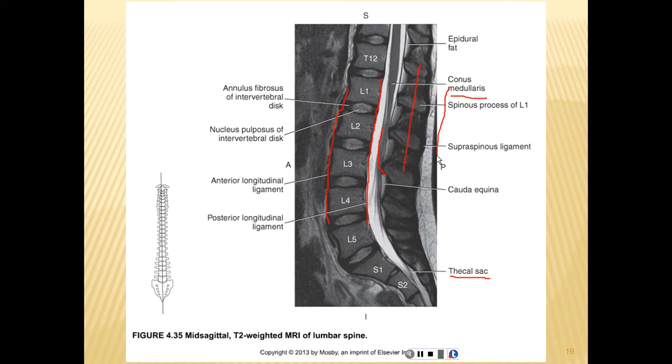So that's why it's important for you to get a correct mid-sagittal image of the spine, because if it's not correct, then the radiologist cannot fully evaluate these four lines to see if there is pathology on the spine.